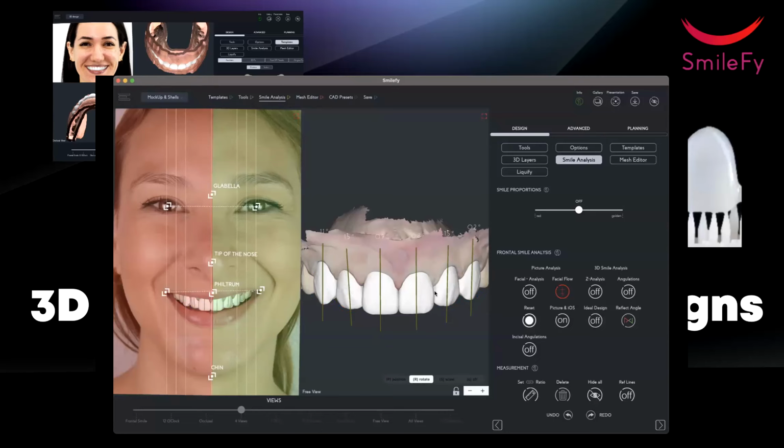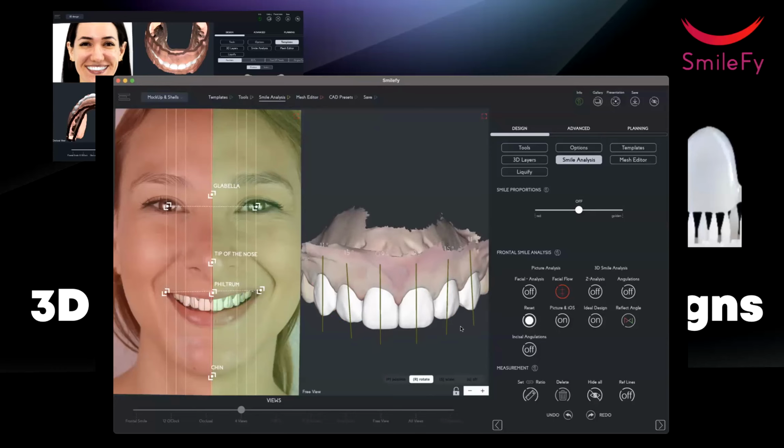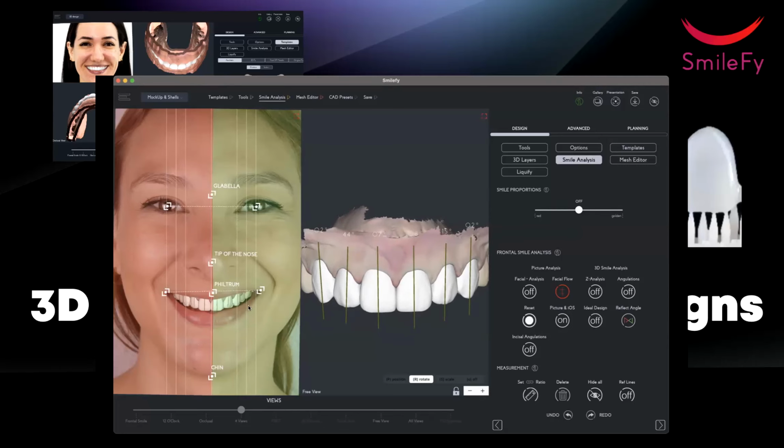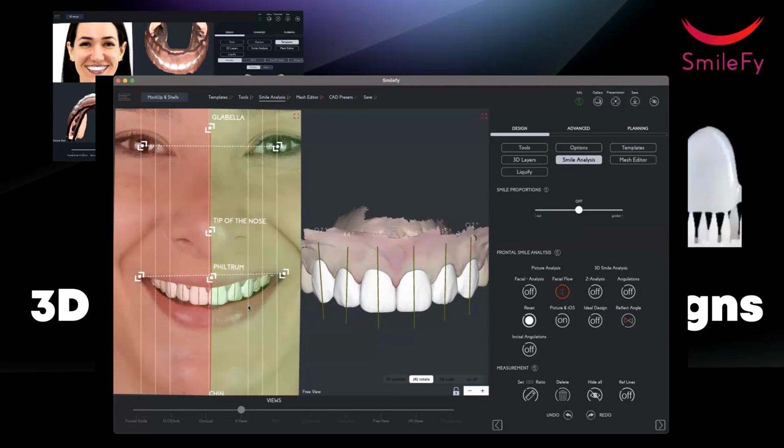It looks better, right? 0.8, 0.9, the central's not bad. And let's see with the canine, maybe the other one, maybe this one. Now we have the canine in the same axial angulation, and it looks better, of course, because if the canines are tilted differently, not so good, right?